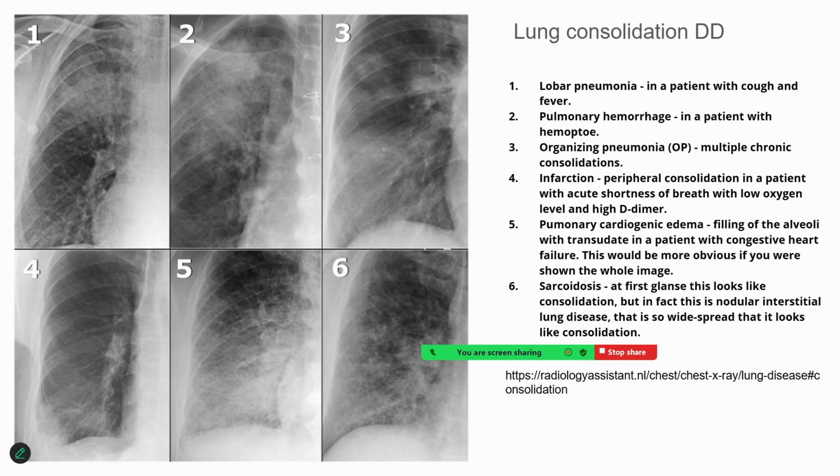Now, one more confusing area in the reading of chest X-ray, particularly in consolidative pathology, is the causes of consolidation. Consolidation is, in the sense, the alveoli becoming opaque in the X-ray. It may be produced by many other causes, not only pneumonia, and it's absolutely necessary to differentiate. A typical pneumonia-produced consolidation would be gradually progressing, with the alveoli filling up with fluid, and the opacity having an anatomical demarcation.